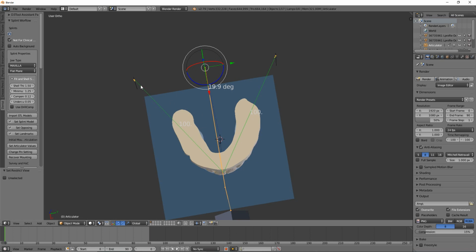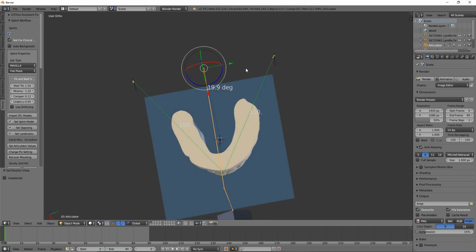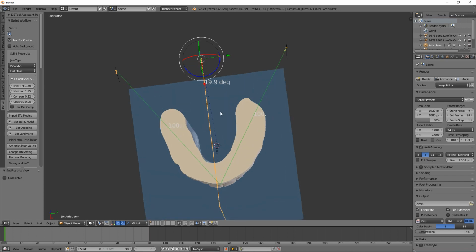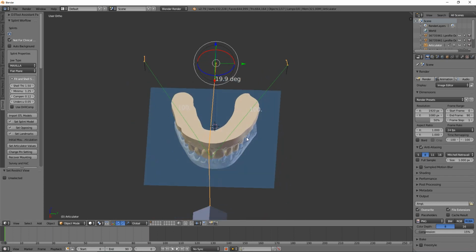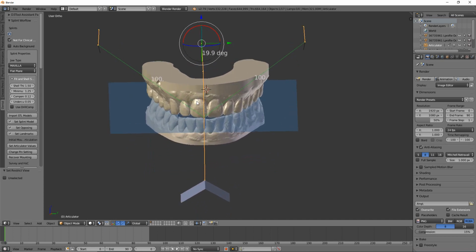So progressive side shift was actually ignored, because if you think about these two angled condylar tracks coming together, that would essentially cause the condyles to be compressed, and so in the newer version that is better taken care of, and I'll show that. The other thing is all the math in the new version has been taken internally.